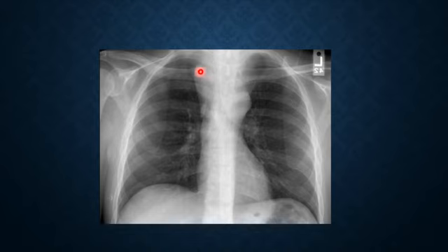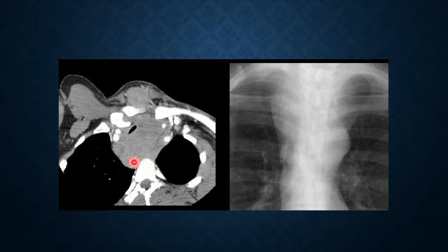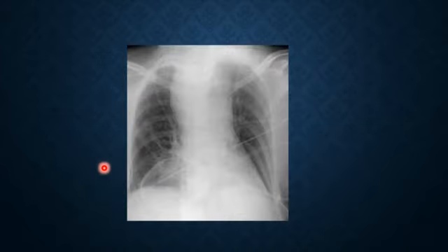It is above the clavicle, well seen here. Not because I said fade, it means to fade. You give me your idea, your opinion. This mass is in the posterior mediastinum. It is well defined above the clavicle here and there because it is surrounded by lung here and there. Get it? This is the main idea.